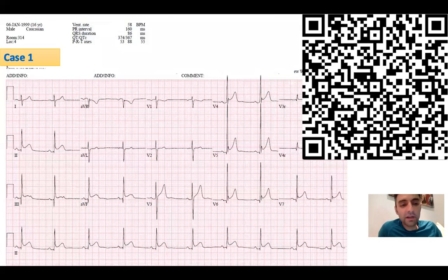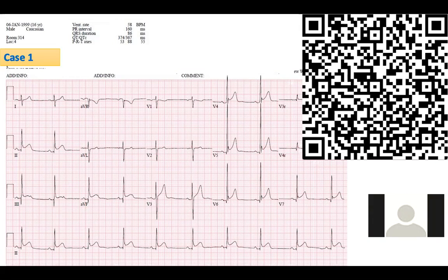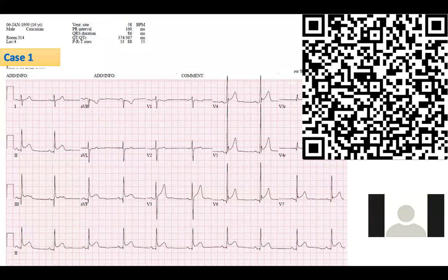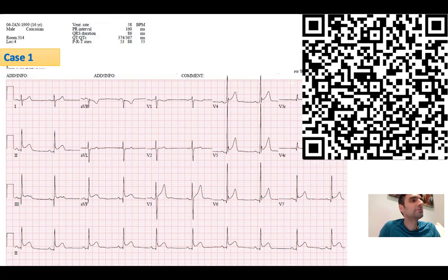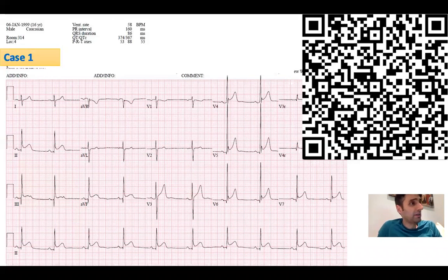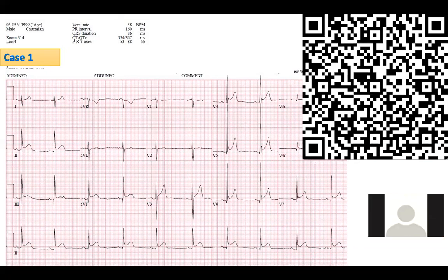Anyways, okay. So what did you guys think? What do you see? Someone can volunteer. This is sinus rhythm. First, sinus rhythm. Okay. Normal right axis deviation, 90 degrees, sure. There are some ST segment changes, but that's what I see. Okay, nice. So there are ST segment changes. Perfect. So when you see ST segment changes, what comes to mind? How do you clarify that?